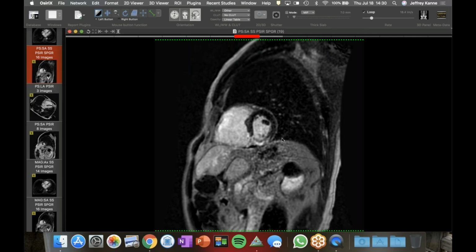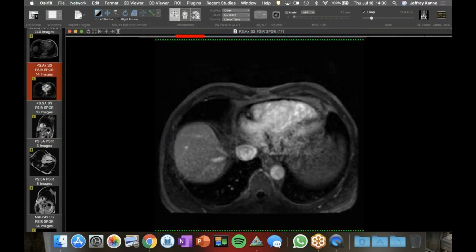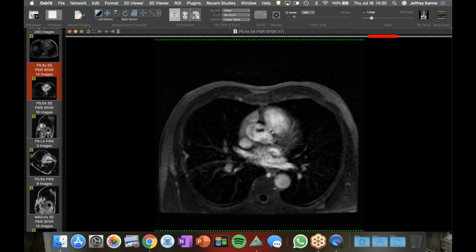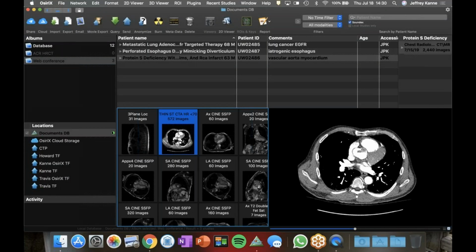So Jeff, that thrombus was on the aortic valve? It was, right? Indeed. And I think you can see it on the cardiac MR too, right? There it is right there. Yeah, it's just sitting in the right sinus. Yeah. So she probably didn't have actual coronary artery disease, that she had an obstruction from that. Exactly. It was probably, wow.